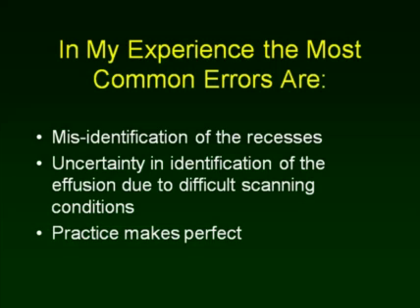And they plan an access track that leads to catastrophe. In addition, another common error is that the examiner just isn't sure that there's an effusion. And again, I wouldn't consider that a major error, because caution is always the best defense. Practice, therefore, makes perfect.